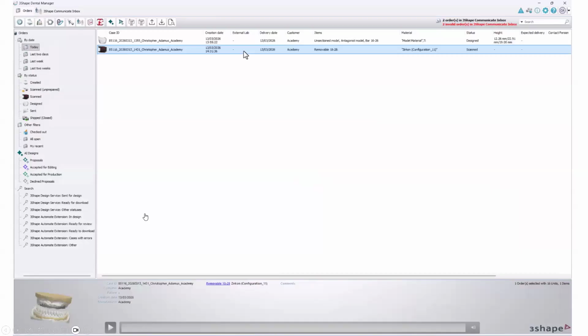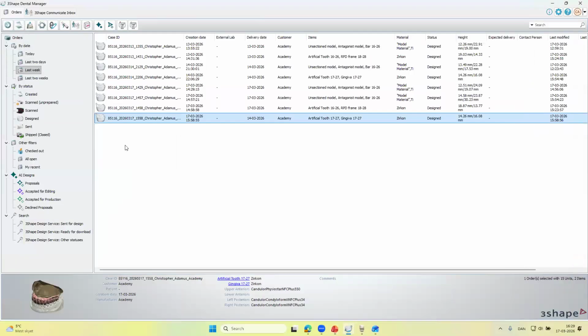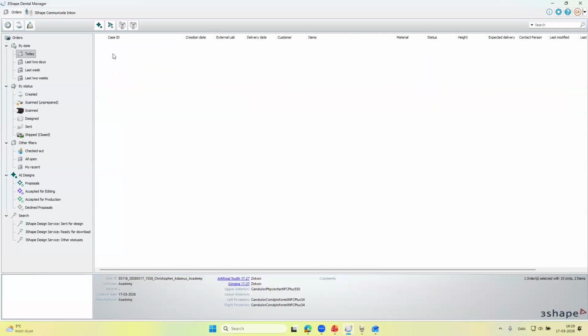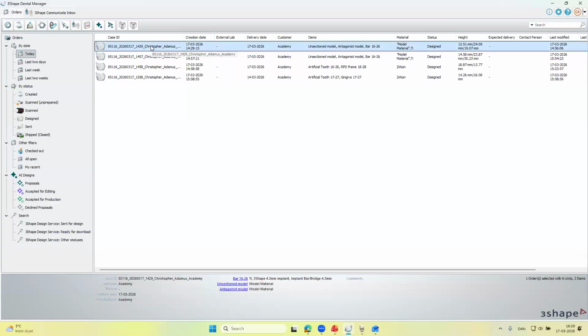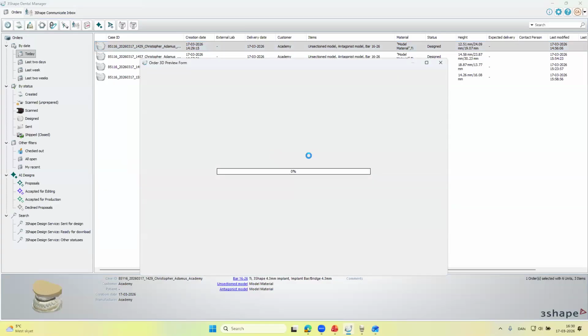All right. So these are, let's say, the benchmarks, the ground rules that I wanted to set for you. So if I will take away the presentation and go back to the software, I've started with designing some bars earlier today. And I used one just like the one that you have seen in the video just a few moments earlier.